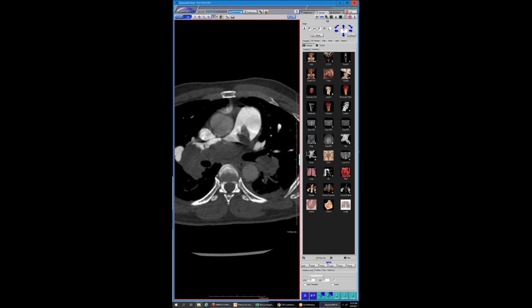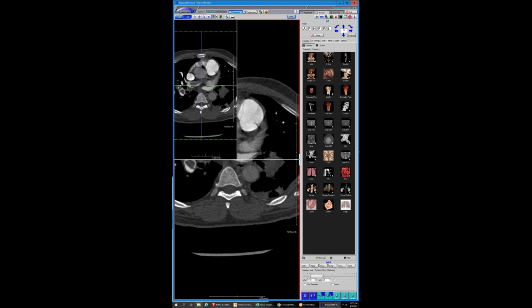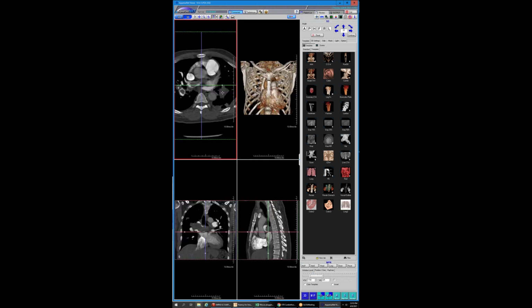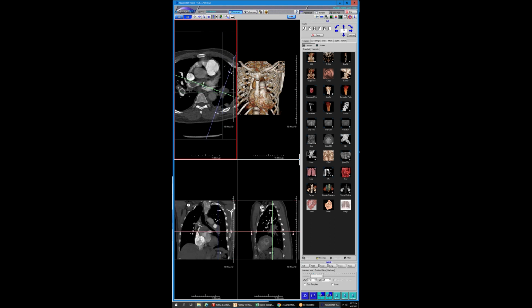You can see the soft tissue component towards the valve in the main PA. That's a pretty good sign, although I've seen plenty of CTEPH do this as well. But the expansion going into lobar and segmental vessels on the other side, usually it's tumor on one side and then creeps towards the other side and expands the other side. But this one is really, really quite bad.